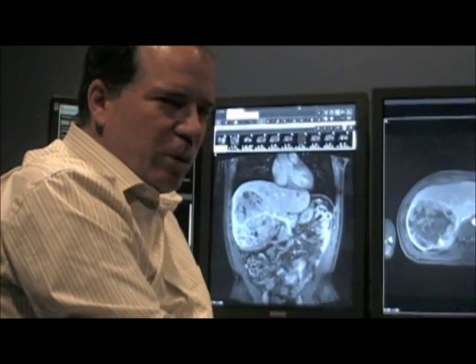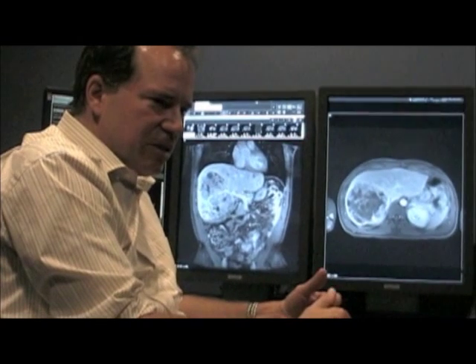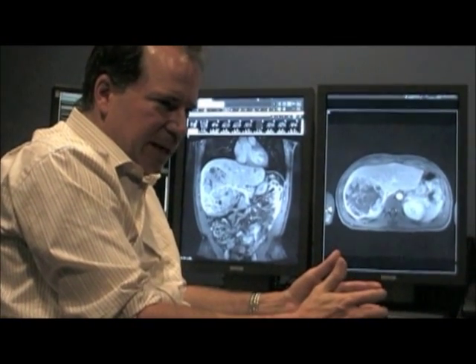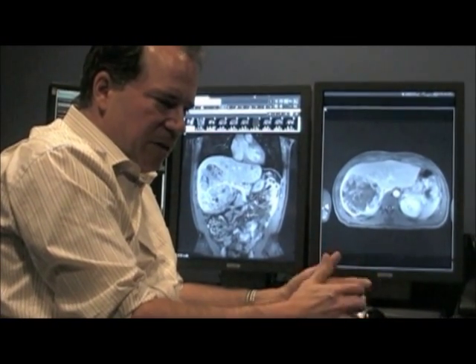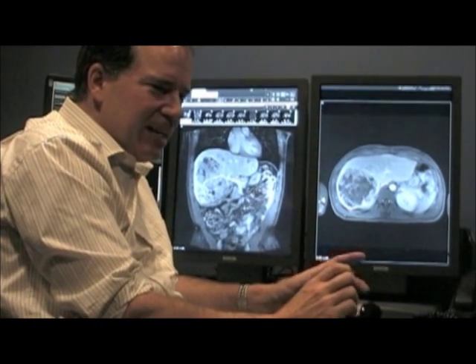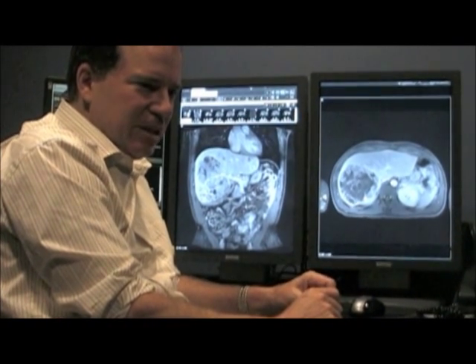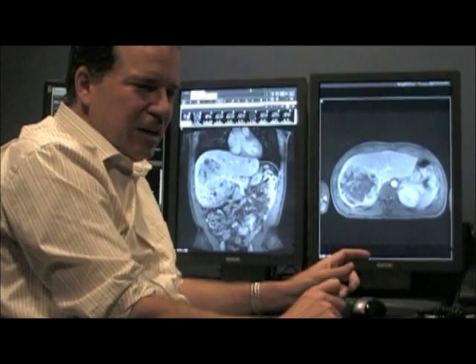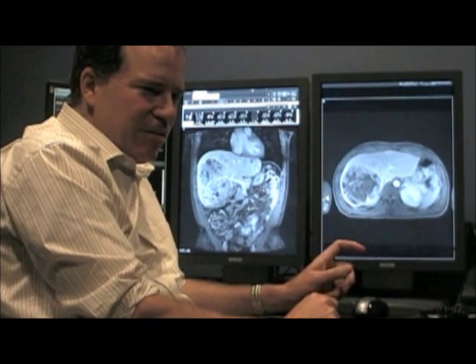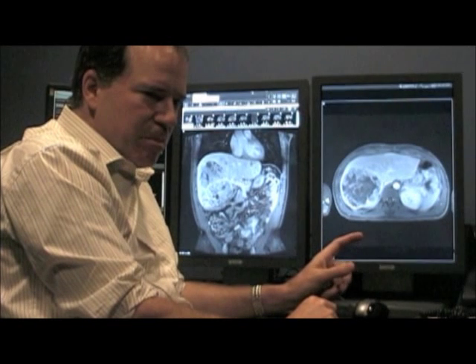Now, what's unusual for recurrent HCC in a patient who had an original diagnosis of HCC and then underwent transplant, the problem with HCC is that HCCs generally are not as bright on T2-weighted images as this one is, and generally we should see more clearly defined washout and late capsular enhancement than we saw in this patient.